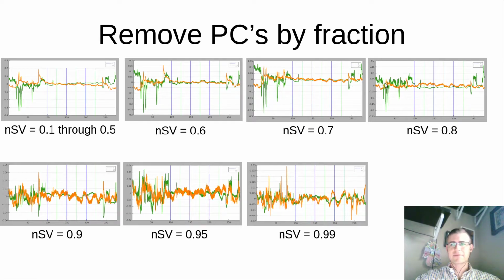0.7, again, same thing happens. 0.8, all of a sudden the values look a little bit more compressed and within range, and then it gets more and more that way. If you look at this, the range of the actual experiment is 0.005, so it's quite small.